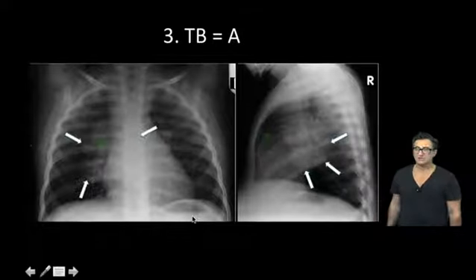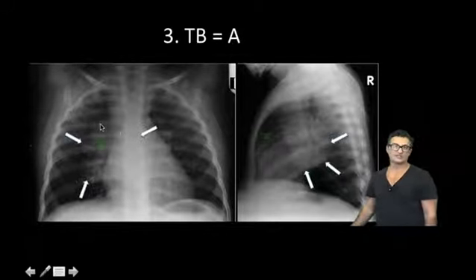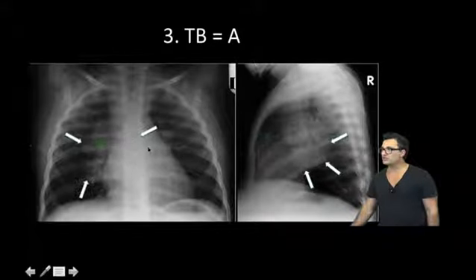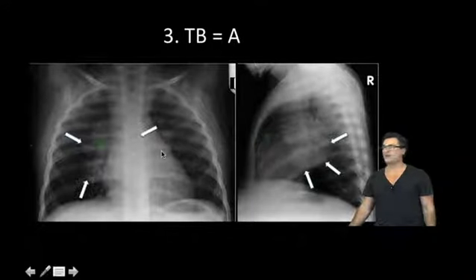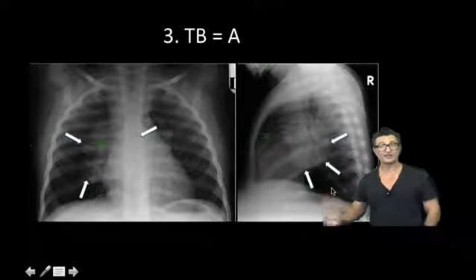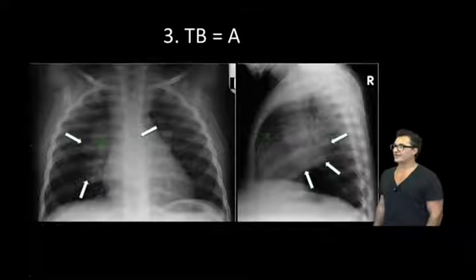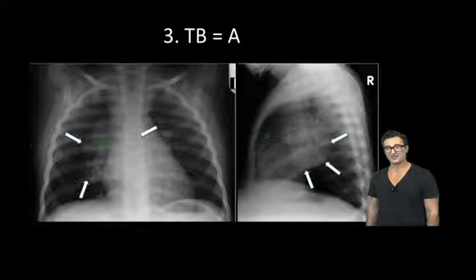I called 3 tuberculosis. I think it's pretty obvious to all of us that there are lobulated masses at the right hilum, and you basically do not see the open V of the vessels. I also point out to you that the left main bronchus is extremely narrowed, which is an indicator that there might be lymphadenopathy behind the heart. And of course, if you don't see this donut, I probably haven't taught you very well, because that is the donut I used in the teaching section, and it's the most obvious donut I have in my arsenal of X-rays for you.